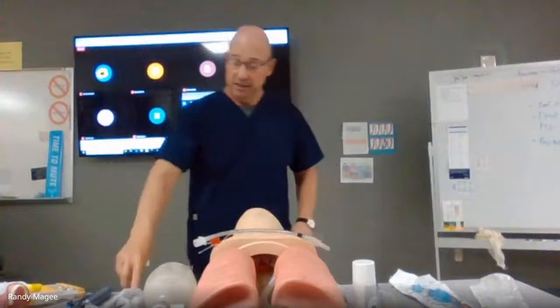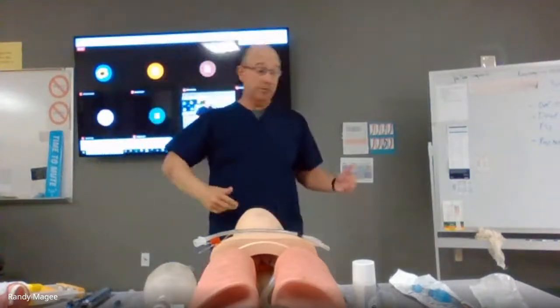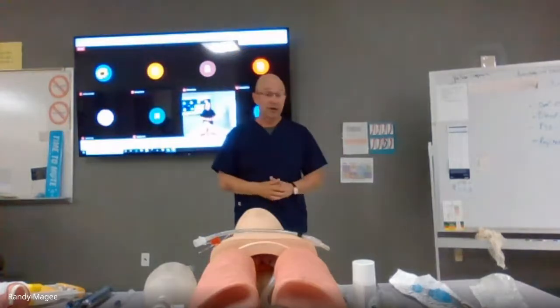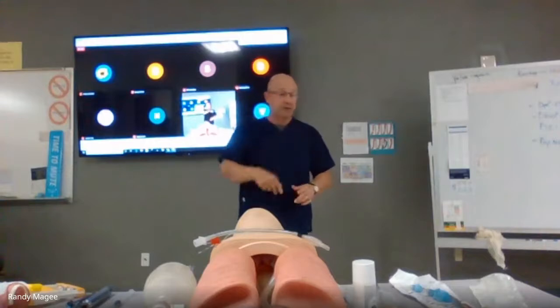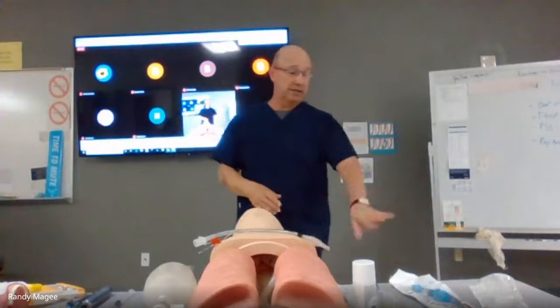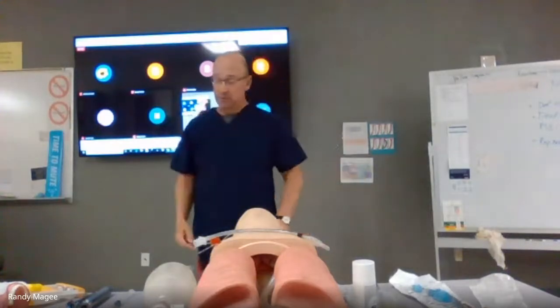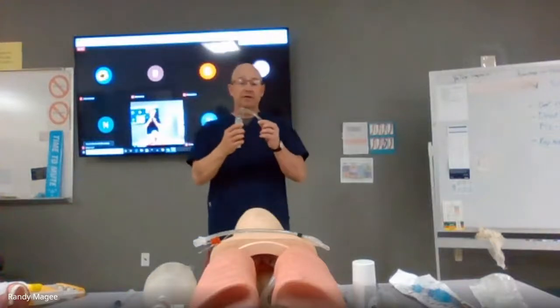If you're doing an intubation, you also probably want in your arsenal somewhere a rescue tube in case you can't get the intubation, and we'll talk about those at the last. We have an LMA and a King Airway here. The King is probably the more modern one. And then the other, you have a laryngoscope.